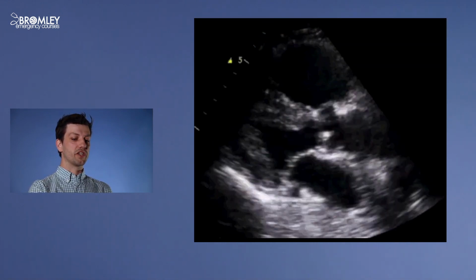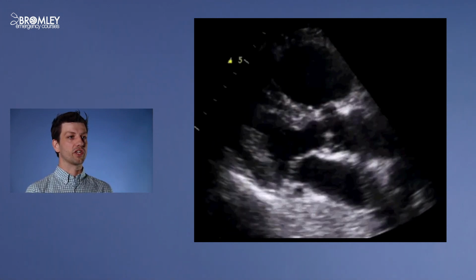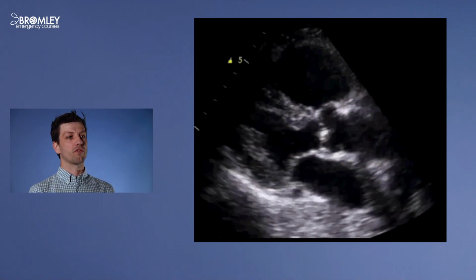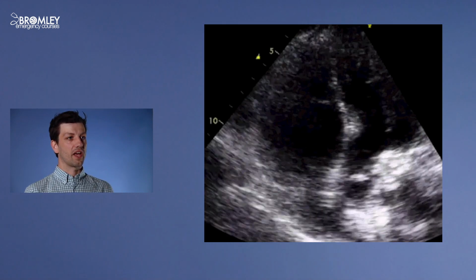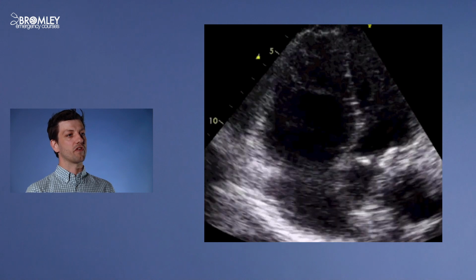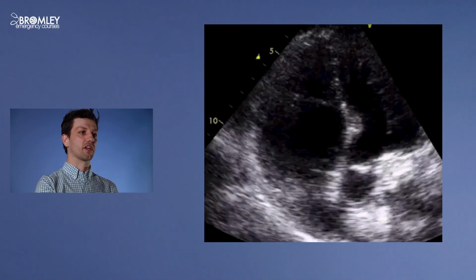And in one of these patients, we've taken an image of the IVC, and we see that that IVC is not collapsing with respiration and is more than 2 centimeters in width. This is a plethoric IVC and would fit with the right heart dilatation that we've seen in a case of PE. And here in the same patient, again, when we're comparing that right ventricle to the left ventricle on the apical 4-chamber view, we can see that that RV is much bigger than the LV, more than the 1-to-1 ratio that would be our cutoff.